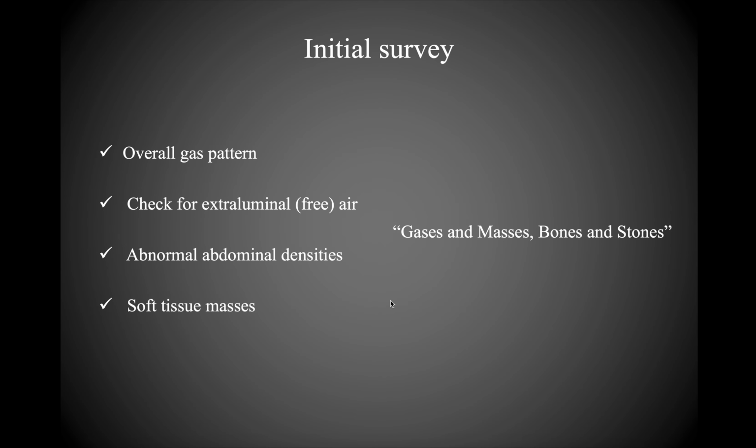And then finally you want to look at the bony structures of the abdominal cavity as well. If you're in an orthopedic specialty, of course that would be an area where you'd definitely be looking at the bones, but much of the time abdominal x-rays are performed to determine why somebody is experiencing abdominal pain. That's far and away the most common reason, though there are situations like with a patient with scoliosis or kyphosis or some other skeletal abnormalities, potential fractures, trauma, where an abdominal x-ray might be taken to observe the bony structures.